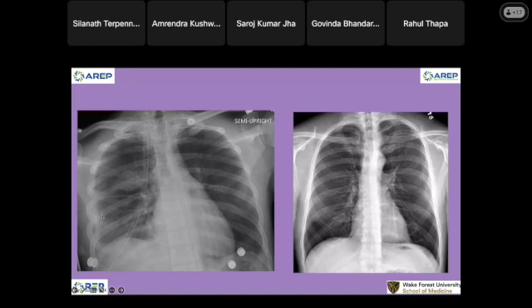I think there's a little prominence of the pulmonary vasculature. Actually, do you see effusion here? Little effusion. This is normal right upper lobe. Right, nice sharp line. This is the minor fissure. The fluid is piling up here below the minor fissure. Is it the right upper lobe or the right middle lobe, you think? Probably some atelectasis or aspiration here in the lung base as well.